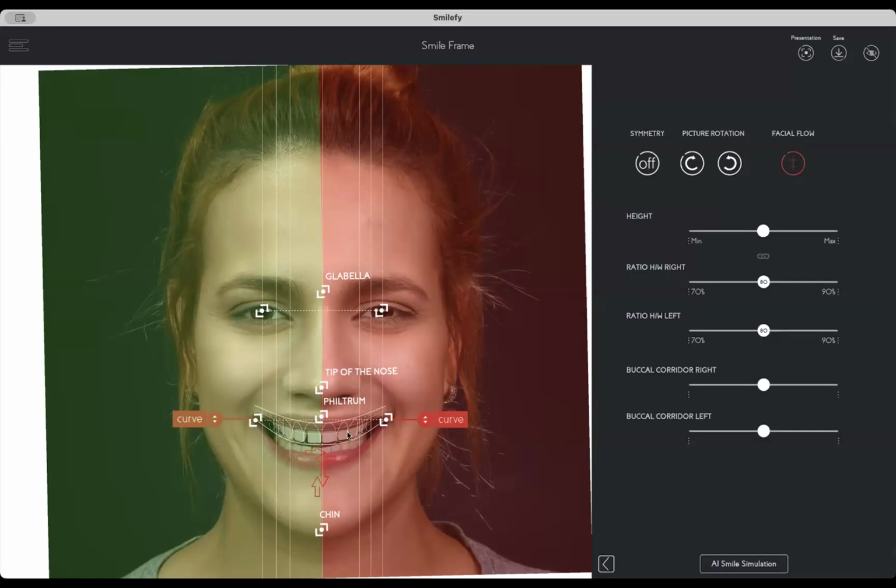The detail is the following one. Let me open the study, and then I can show you. Just a second.